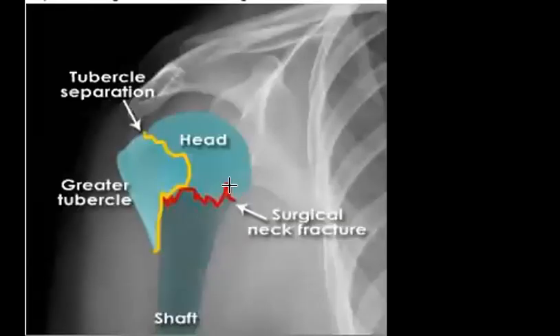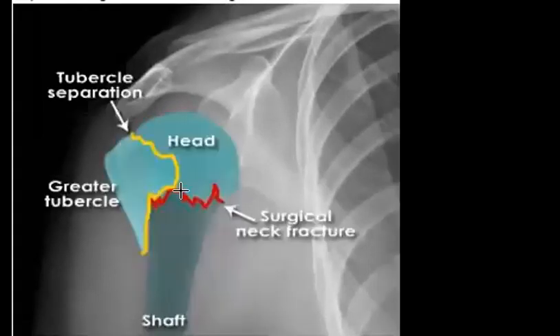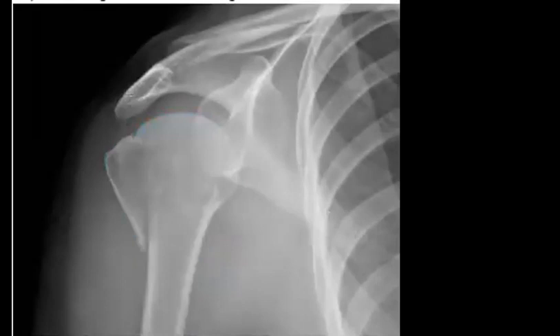Humeral head fractures are very easy sometimes, like this case. So you can here see the transverse fracture with surgical neck involvement and the greater tubercle, and you can see the separation. And they like to ask you in the MCQ about what is called Neer's classification of the humeral head. So one fragment, two fragment, or three or four, right?